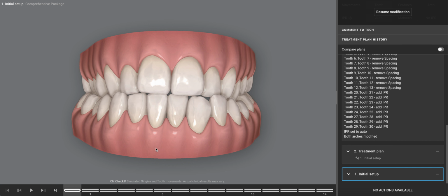And what I would say here is unraveling this particular anterior relationship without fixing the posterior transverse relationship is going to be hard. But I did put together a treatment plan that I think will get the patient's needs solved with a low risk final outcome.